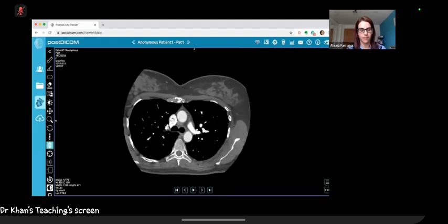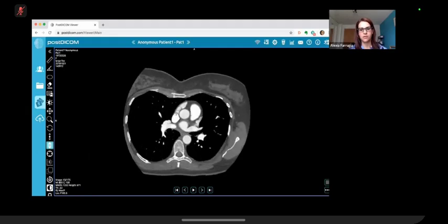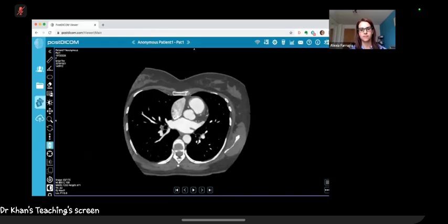Okay. Yep. So have a look, focus on the coronaries, and then I will scroll again and you can start to describe what you see. She's 48.